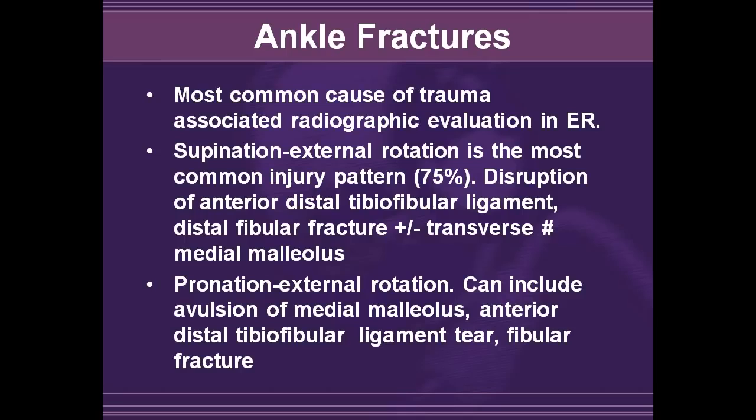So ankle fractures are the most common cause of trauma-associated radiographic evaluation in ER patients. Supination and external rotation is the most common type of injury, and disruption of the anterior distal tibiofibular ligament or distal fibular fracture with or without transverse medial malleolar fracture.